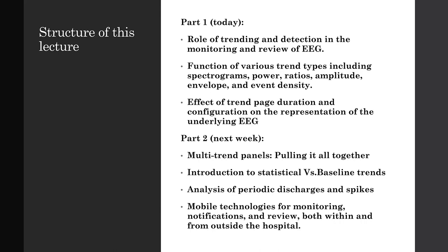What is the trend showing? What happens when I adjust it? What happens when I zoom in and out time-wise? Now in part 2, we'll look at sets of trends working together, what we call trend panels. We'll look at the utility of statistical change trending and how we can now track changes over time across hours or even days of recording.